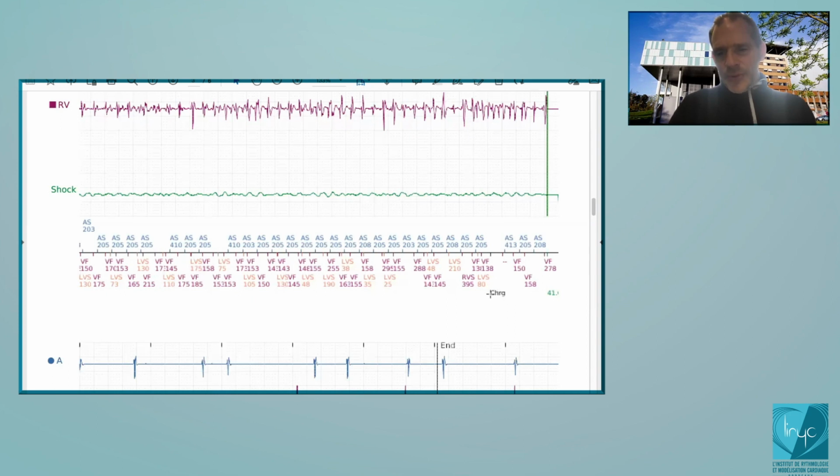You see? So end of the charge, this cycle, VF, here it's 300 milliseconds. You have less than 500 milliseconds between the end of the charge and this second cycle. Since there is less than 500 milliseconds, you need to wait for the next one. Okay? So that's what is called a divert window.